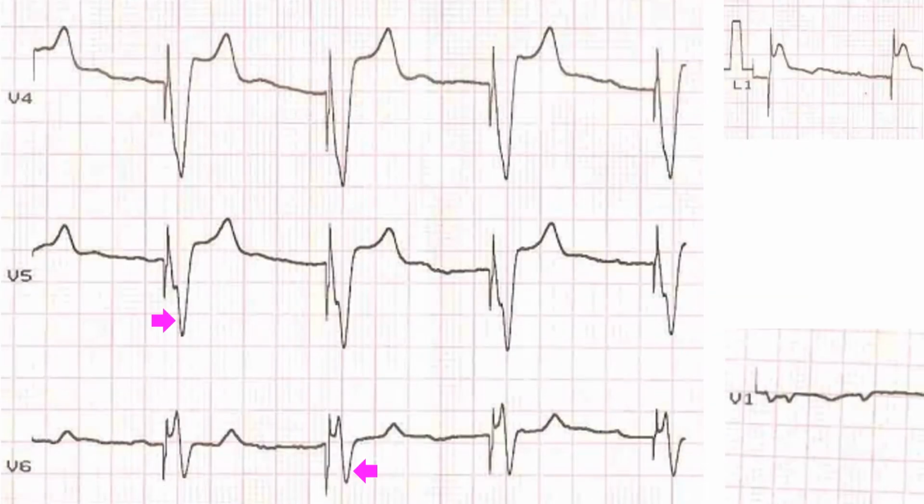Though we would expect a dominant positive QRS in V5, V6 in a left bundle branch block pattern with right ventricular pacing, when the pacing is done from the right ventricular apex, V5, V6 shows a predominantly negative QRS complex as the activation proceeds away from the apical region. This is evident in the tracing shown.